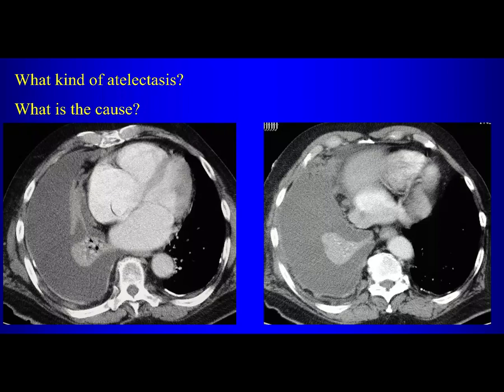So the cause of the passive atelectasis in this patient is the large right pleural effusion. Are we done with this case? Well, the natural question to ask yourself is, why does the patient have a large right pleural effusion? Tell me. Some small plaques, nodular thickening. So what are you thinking? It could be asbestos. So how do you know it's asbestos?